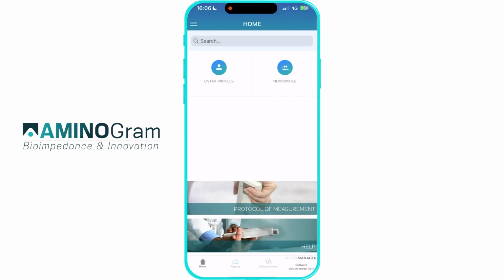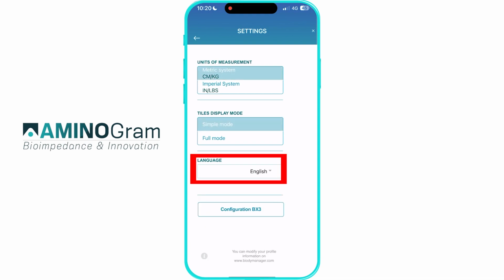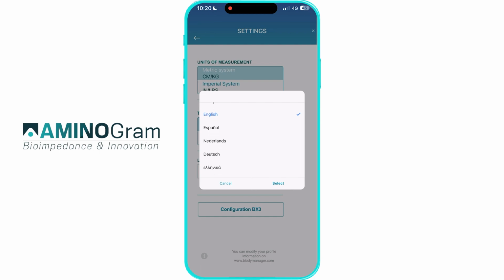Before we get started, let's take a look at some optional settings. Click on the top left, then select Settings. You can change the language of the application by tapping on Language and choosing your preferred language.